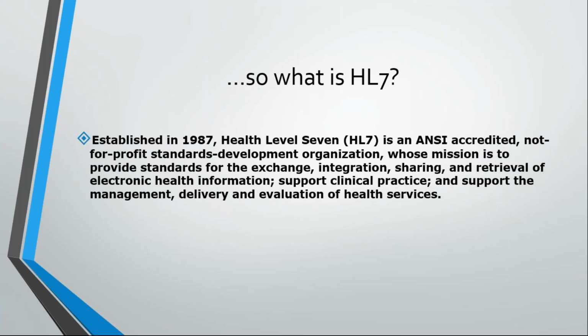Yep. So you can say two ways. One, we have some old software which has its built-in integration mechanism which will generate HL7 and send it. That is one way. We have another approach called an interface engine, which will actually perform that work for us, which will extract the data from the database, generate HL7 and send it over.